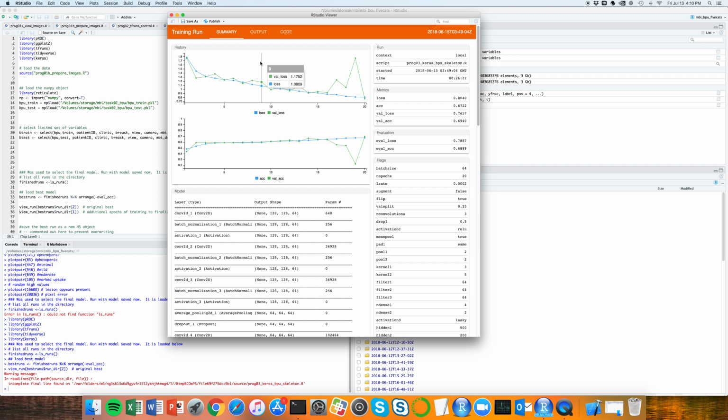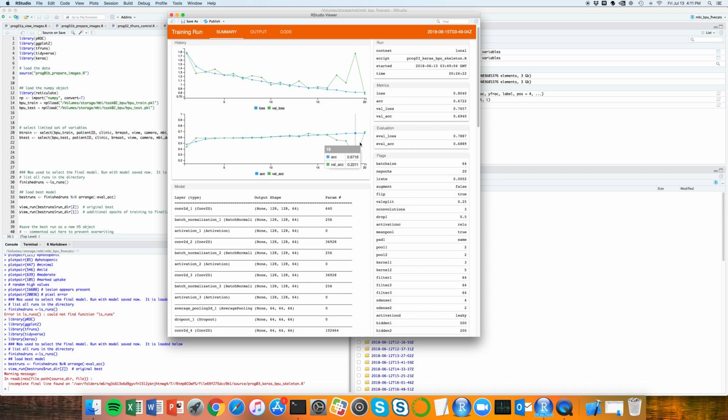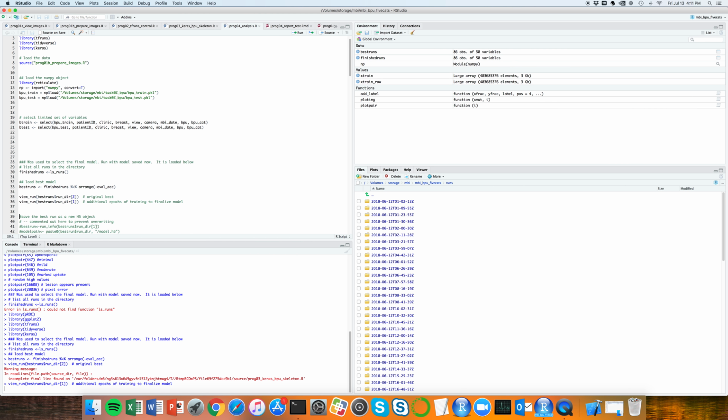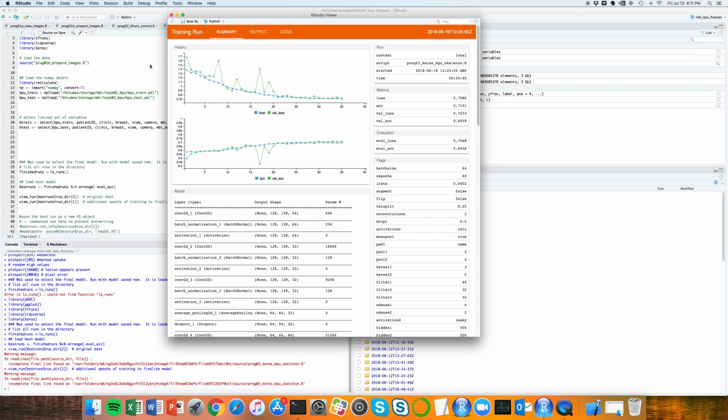This is one of the final candidate models in terms of architecture. You can see there was a little bit of a blip here, and so one of the things I set out to do was to retrain it, allowing a little additional time as well as adjusting the learning rate on plateau. And so our final resulting model was this one, where you can see that it gets through this rough patch and then settles back down and performance looks right. And so at this point it terminated due to no longer observing performance improvement.